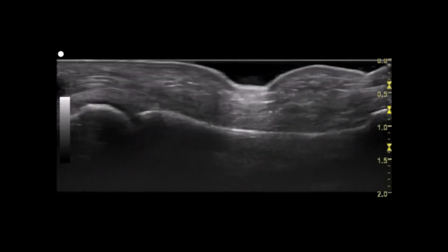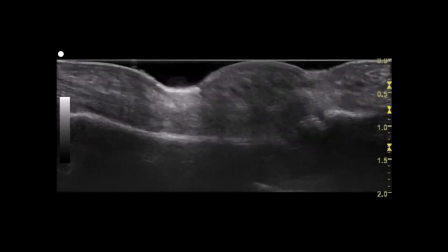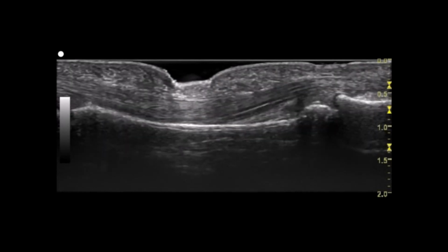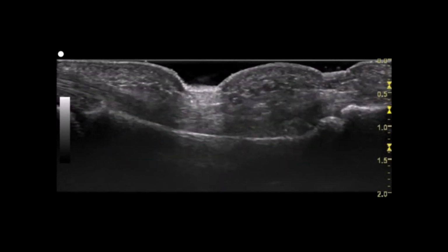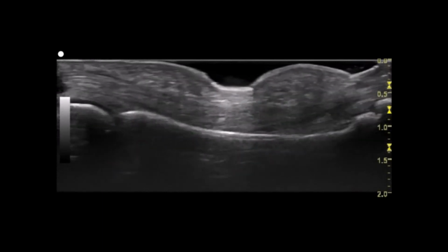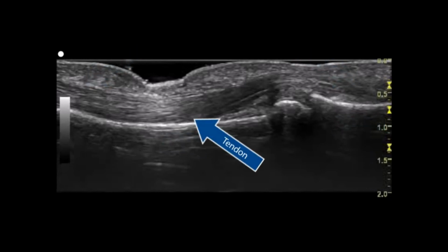An object is anisotropic if it has properties that differ according to the direction of measurement. Different tissues have variable degrees of anisotropy. Nerves and tendons are quite anisotropic. Tendons are typically the most anisotropic structure visualized during MSK ultrasonography. The arrow in this image points to a tendon.